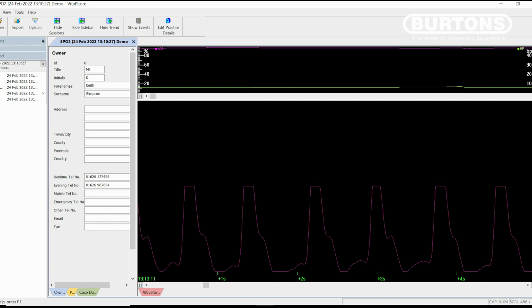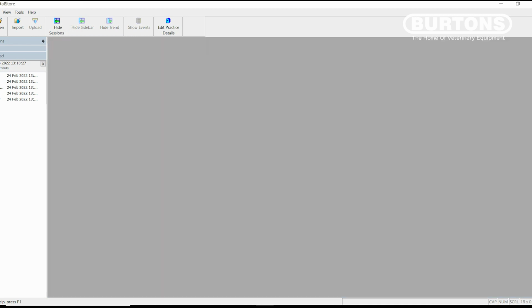This option is not included in the standard software, as there is a fee for this option because it involves quite a lot of intense processing and extra information that is not included in the normal package. One of the few ones that aren't automatically included. Okay, so I think we have the idea. We'll close that down now for SpO2 and we'll look at temperature.